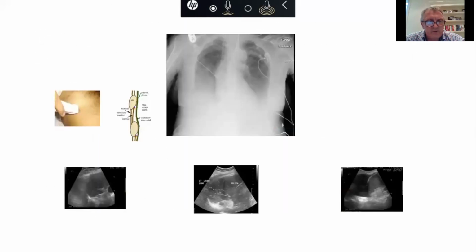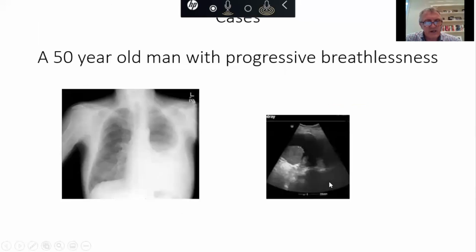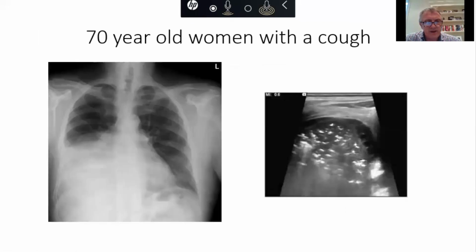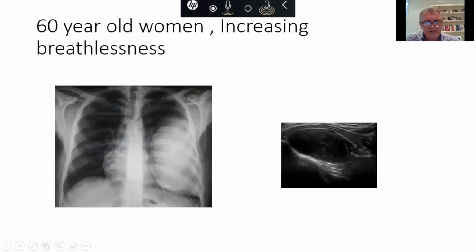We talked about what we can see at the bases. Again, normal lung here, consolidation and fluid. I hope you've got this picture in your mind, what a pleural effusion looks like. And then we've talked about chest trauma, rib fractures, and we talked about effusions and masses. We've talked about consolidation. We've talked about collections, unilateral exudatives. This is infection, empyema. We've talked about, again, masses, or is it a collection? Well, ultrasound will tell you it's cystic or solid. This is solid. It's a mass.